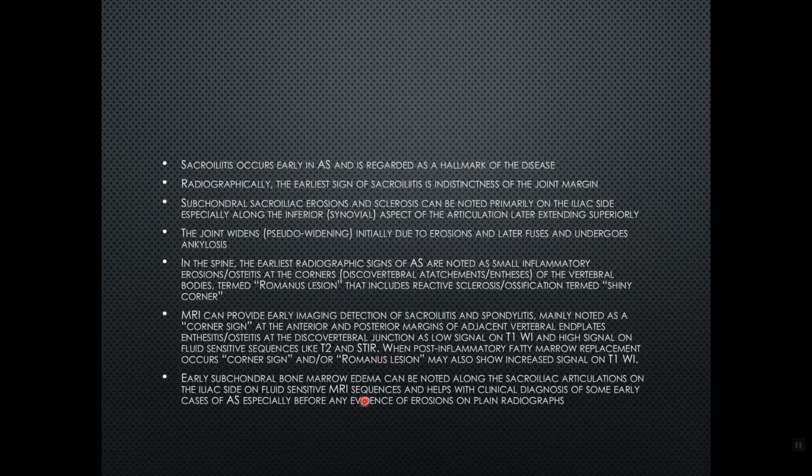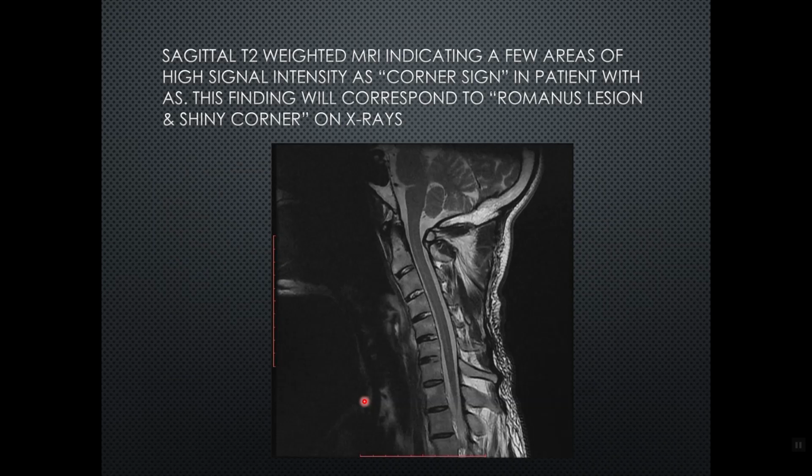So here's the case for you. Sagittal MRI, T2 weighted imaging, so you can see some overall impression. You can look at the spine and see if there's anything abnormal. Well, there are a few abnormalities in marrow. Typically you can see that marrow is somewhat distributed okay, but then suddenly you have that sort of increased signal intensity somewhere at this level. So you can see that marrow signal intensity, and that's certainly abnormal.